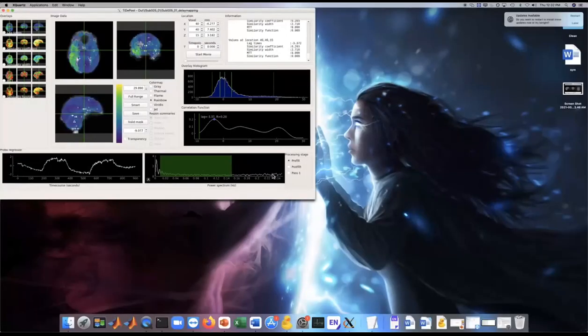Now this is the scan before revascularization, as I said, and you see the lag map up top. Right side is left and left is right. You see this huge area on the right where blood flow is very delayed. That's the green and yellow. In addition, if you look at the lag distribution on the right, you see a rather wide distribution instead of a peaky one, slightly skewed to the right towards longer delays. So there's a wide range of lags here, and they're longer than usual.